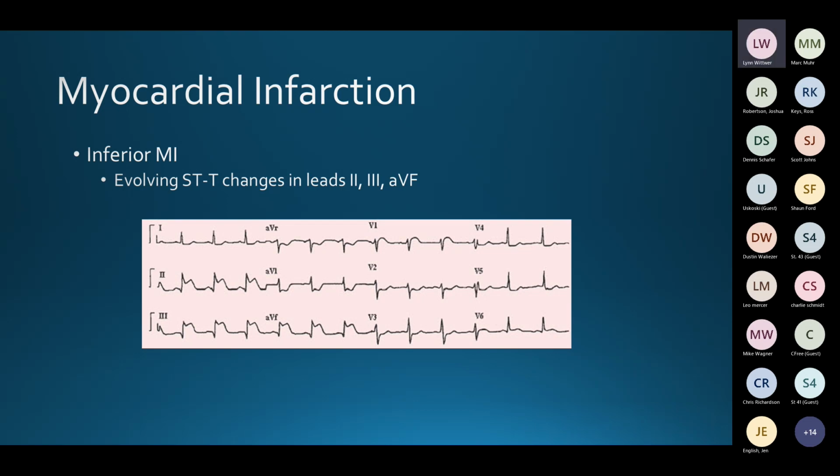But you see 2, 3, AVF, marked elevation, and you see some reciprocal changes in AVL and in lead 1. Also some lateral changes likely too.